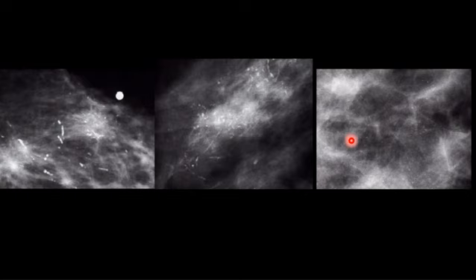All of them are high grade BI-RADS, like BI-RADS 4, 4C, 5. All of them are suspicious. However, it's not like this, it's not like this, everyone has its own appearance. These are the kinds of calcifications you need to keep in mind, to be worried about. Here you have linear, you have some clefts, you have relatively different densities.